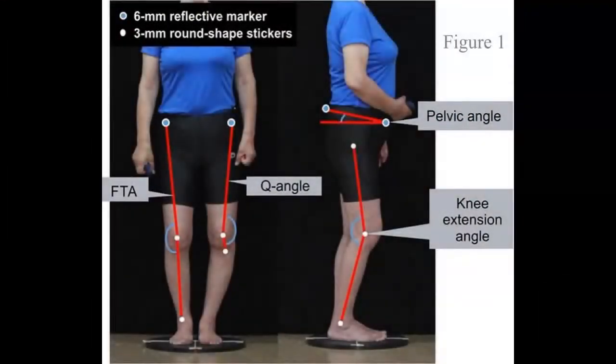To pre-process, the reflective markers must be connected, such as the picture displayed in Figure 1, in order to be able to calculate joint angles and moments. Our MatLab program will calculate these angles, including our angles of interest, which is the Q angle and genu varum valgum.